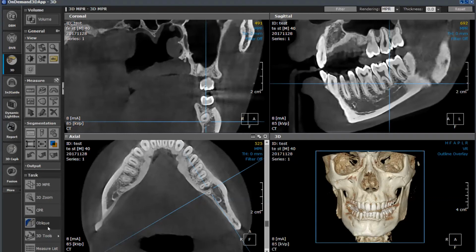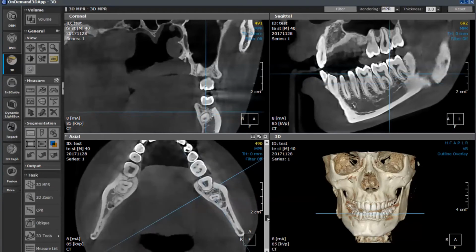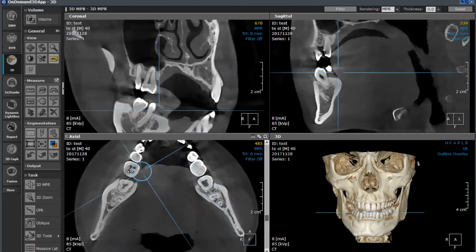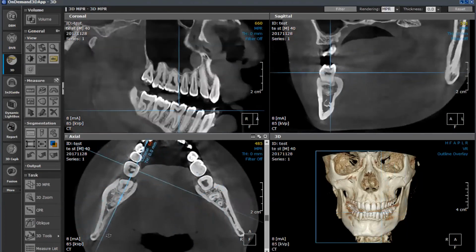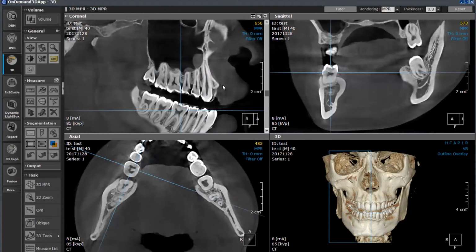Now, not all the time are you going to find a tooth that has a big enough canal to give you a clear picture. So going over to someplace like this one over here, if I were to do the same thing, and I'll move my cursor over, on this one here, well, that looks pretty open and clear in there.